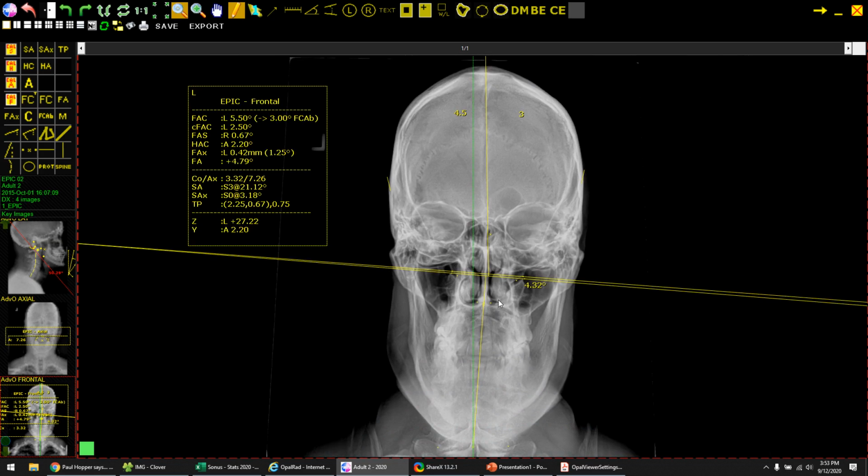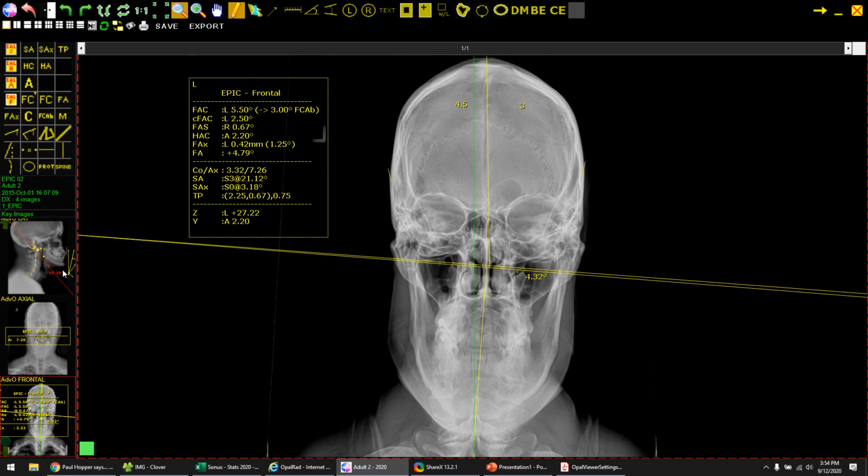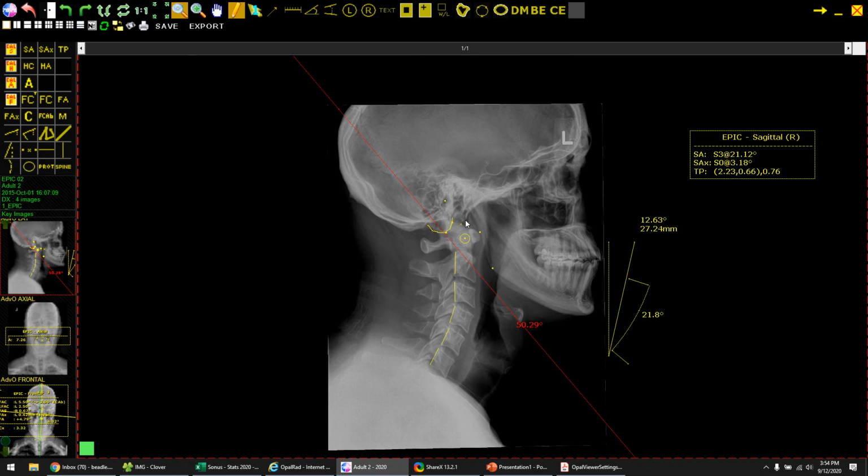One, when I'm analyzing any of those structures, take out the facial structures that are just not needed. So when I'm looking at the skull, everything's fine up here. When I'm looking at the condyles, be able to take out the facial structures so that I can actually see the condyles. And then when I'm looking at C2 down to C7, taking out the facial features so that I can see clearly what is that C2 to C7 direction. From this perspective, again, what I would want to see is where's the transverse process in relationship to the skin, so then I can triangulate that better. I can visualize that better when I'm adjusting the patient.